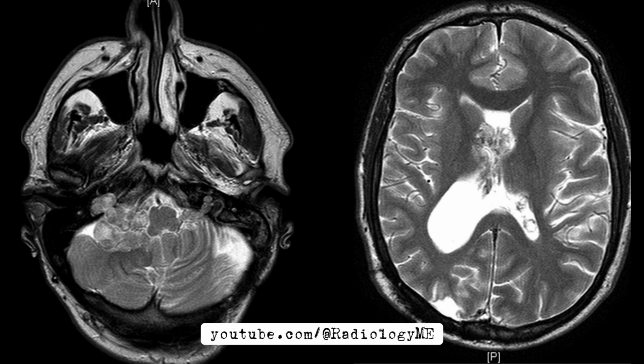These lesions appear iso-intense on the T2 weighted sequence, extending along the vestibulocochlear nerves into the enlarged internal acoustic canals. This extension is a crucial detail, as it indicates the involvement of cranial nerves and helps explain the patient's clinical symptoms of hearing loss and tinnitus.